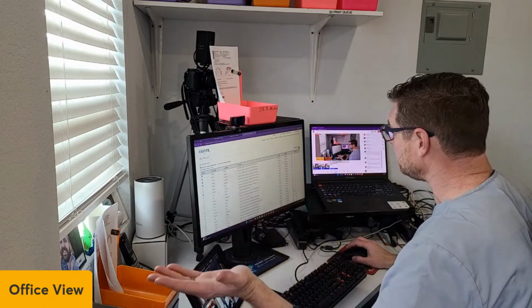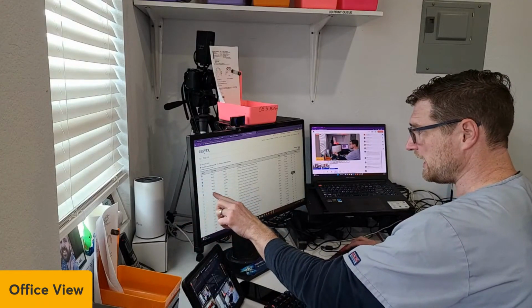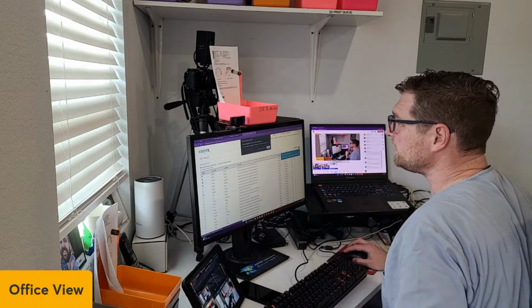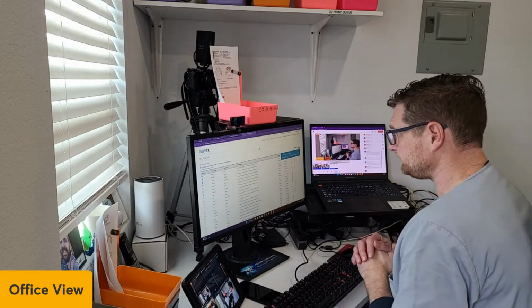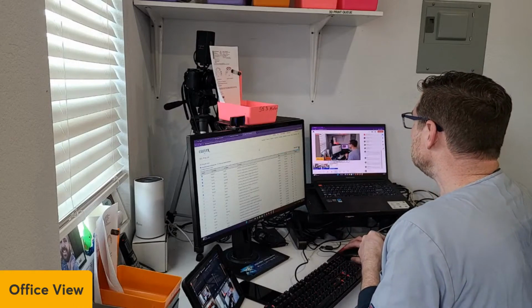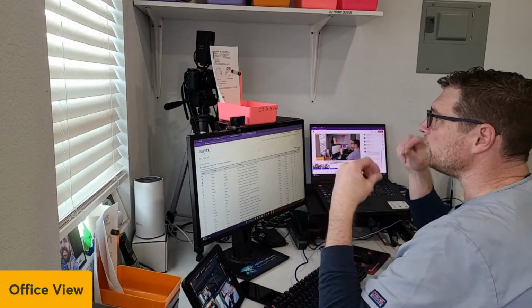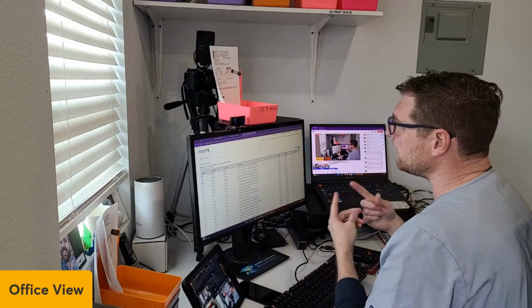Hopefully this will work. But once I have these all checked and I have print it checked, I'm going to click this button. Now this will take a little while. Yeah, always. Yeah, open EasyRx web extension. I always set it to always. That never pops up anymore. So once I click that, it's going to start downloading in the background all those models, not to my hard drive, but to my RAM. So it's good to have a computer with a lot of RAM.